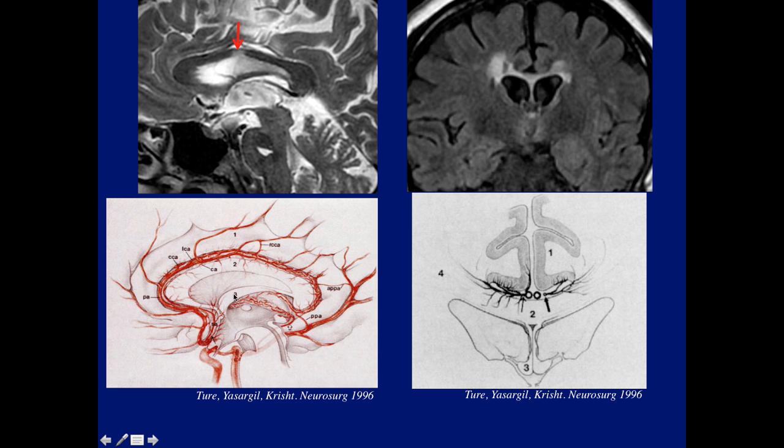This was a small infarct, and this is a study showing the vascular supply of the corpus callosum. The pericallosal artery and also the posterior branches coming off the posterior cerebral artery provide perforating branches that go perpendicular to supply the corpus callosum as well as the cingulate gyrus. So sometimes, most likely after trauma or bleeds, there will be interruption of these perforating fibers, and you may get a localized infarct, like in this case. So this is a limited infarct of the corpus callosum.